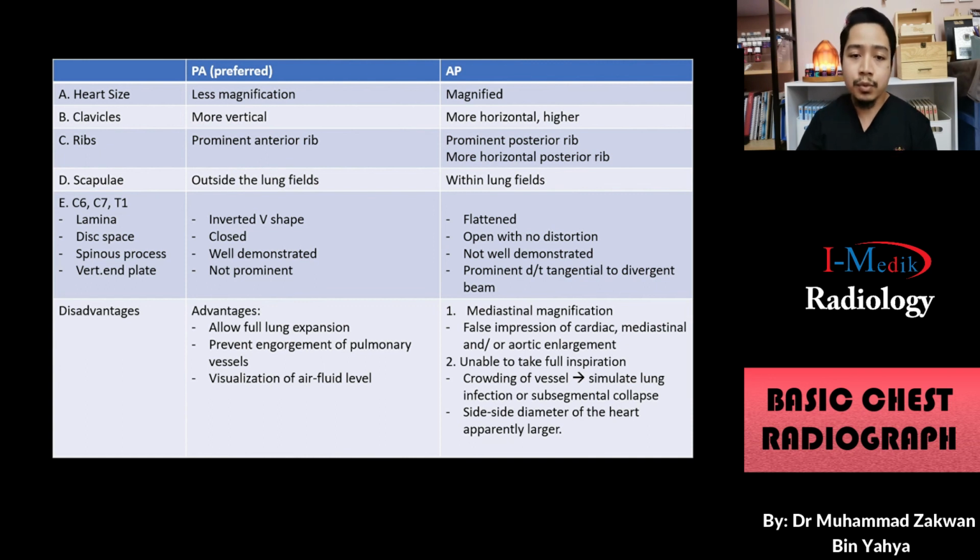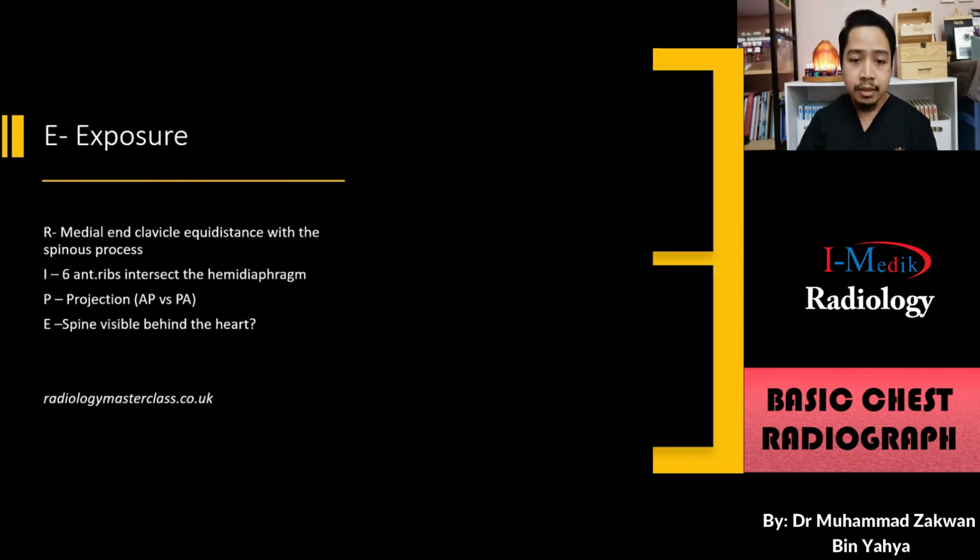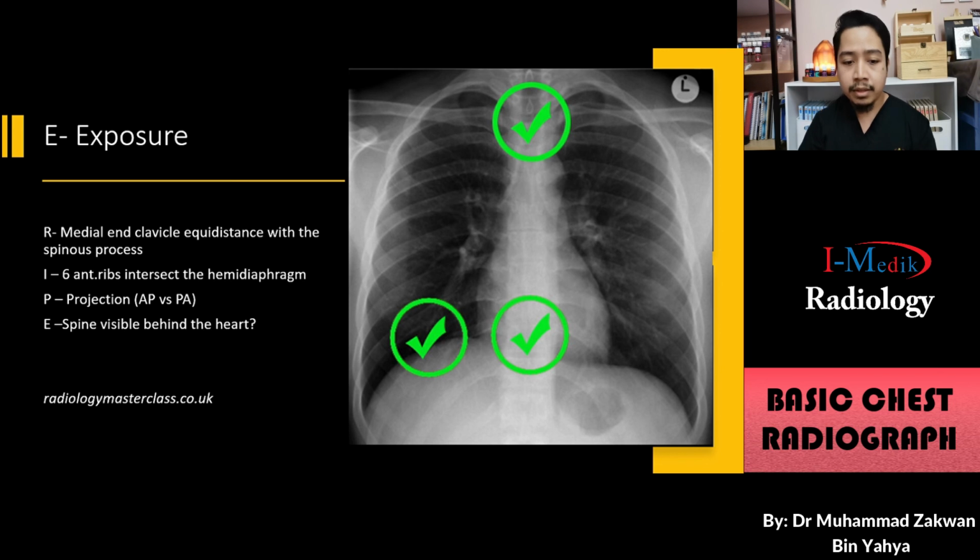Okay, the last one, exposure. For the exposure, we have to see at least the spine behind the heart. The spine is visible behind the heart. Okay, you look here. As a summary for the quality.